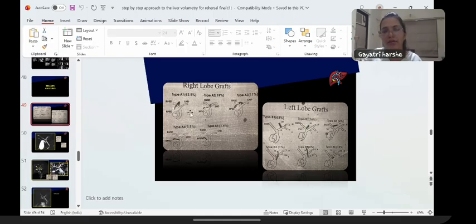If it is a right lobe graft, then even if it is type A1 anatomy, that is, the right hepatic duct is formed by right anterior as well as right posterior sectoral duct, but you don't get good length, at least 5 millimeter for anastomosis, then that patient can have two ductal anastomoses.